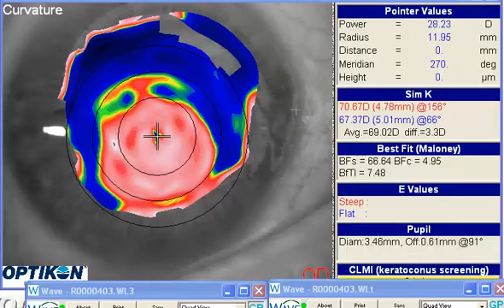out the window. And the first thing we tend to struggle with these topographies, as you know, we get some data right in through here, but because that cone is so steep, you really lose a lot of data out here in the peripheral part of the cornea. So we're really relying on the wave extrapolation. The problem is if you've got hardly any data out here, for example, in this area, wave is going to probably make some inherent mistakes in interpreting that cornea because it's going to extrapolate off through here. You get some better data up in these areas, and these are almost impossible to get around because that cone is so steep. And so with that said, when we're looking at this case, there's a couple options.